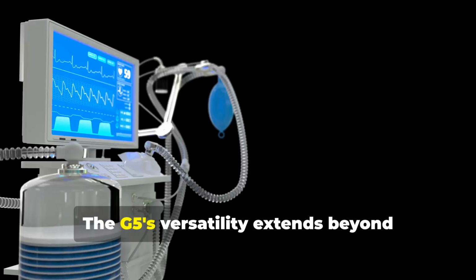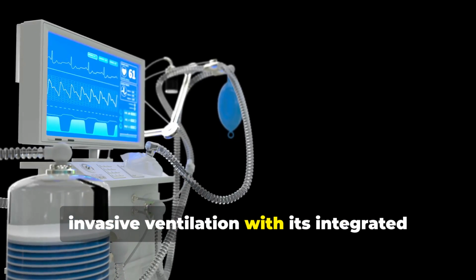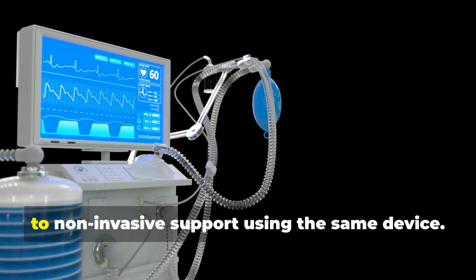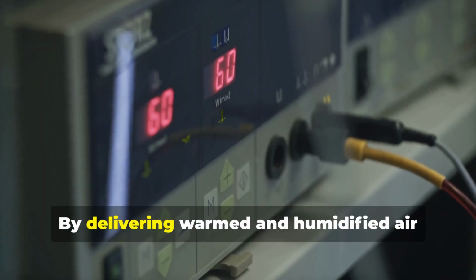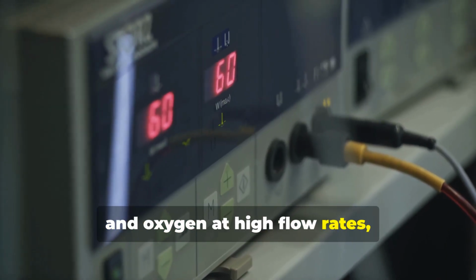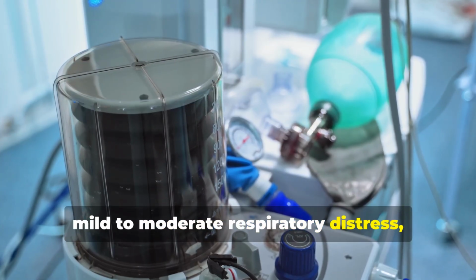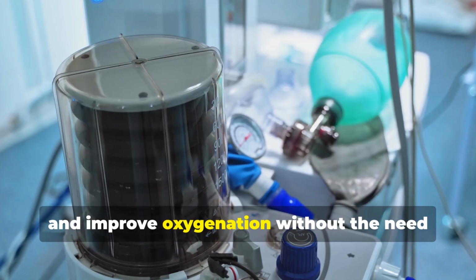The G5's versatility extends beyond invasive ventilation with its integrated high-flow oxygen therapy capabilities. This allows for a seamless transition to non-invasive support using the same device. By delivering warmed and humidified air and oxygen at high flow rates, it provides comfortable and effective respiratory support for patients with mild to moderate respiratory distress, helping to reduce the work of breathing and improve oxygenation without the need for intubation.